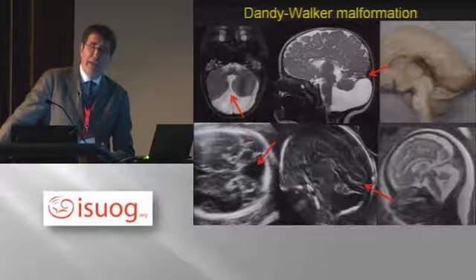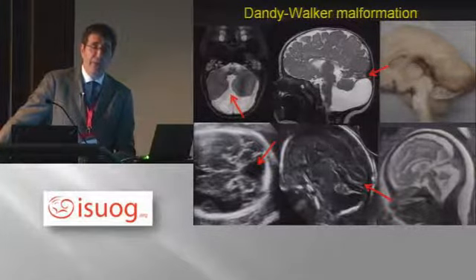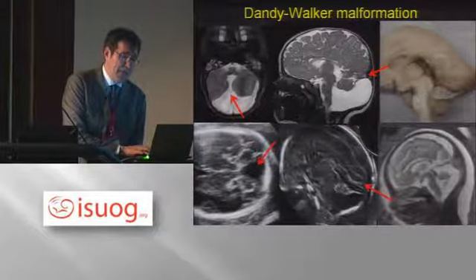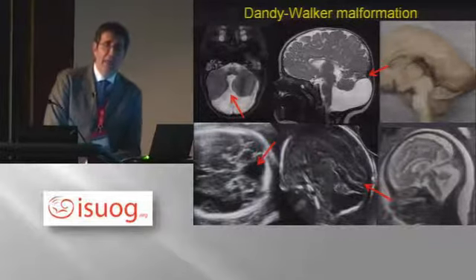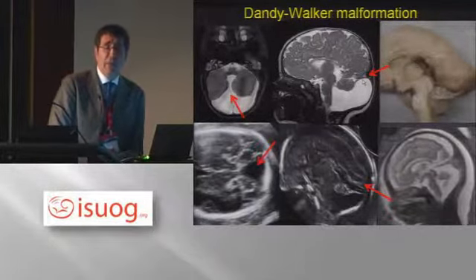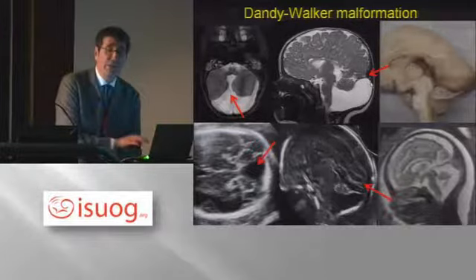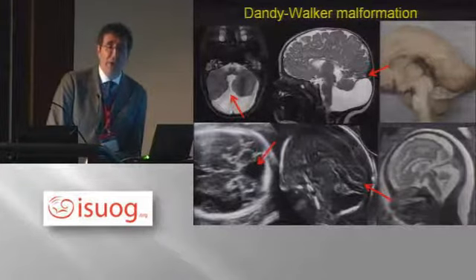Now, I would say that there are mainly two findings that are important. The cisterna magna is much bigger. And you can see that it has become sort of a square. And the most important thing that tells you that the cisterna magna is big is that the brain has been pushed upward. The tentorium, which is the tent to the posterior fossa, where the straight sinus runs, instead of being down slanting, as it normally happens, as you can see, it is horizontal.